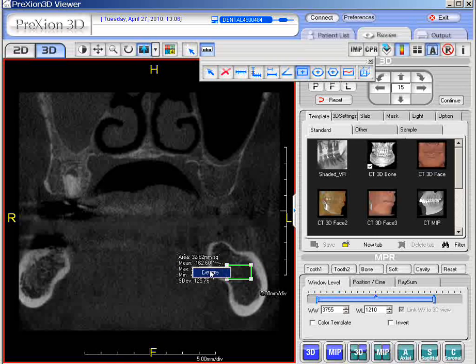Now, let's go to the next shape, the ellipse. So we draw an ellipse. Let's stay more in the cortical bone just for an example. So here's cortical bone in the ellipse feature, and you can see that we have less variation because the cortical bone is a lot more in a particular range. So anyway, that is the ellipse with the cortical bone.